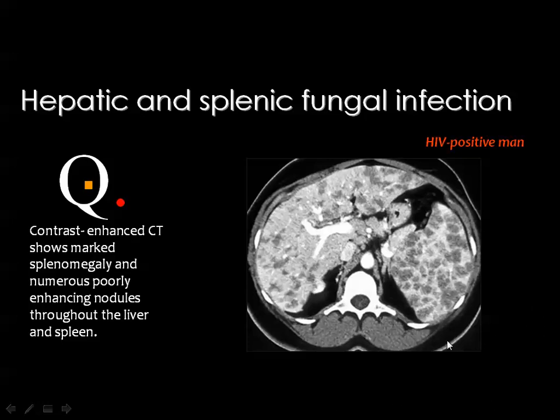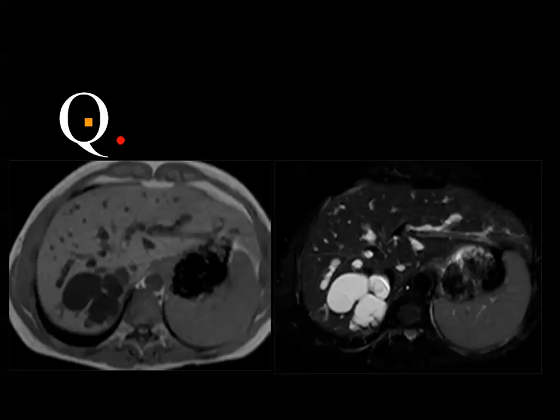If you are sure that these lesions are solid. But many times we use ultrasound and the MRI to be sure that these lesions are not solid but cystic. Then if you say that I would suggest the possibility of fungus and the possibility of lymphoma, then you are right, no problem for this, but you should include fungus in the differential diagnosis.